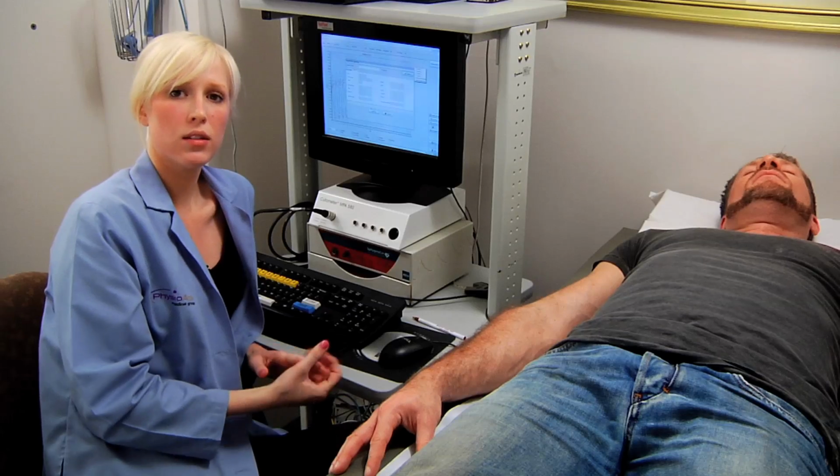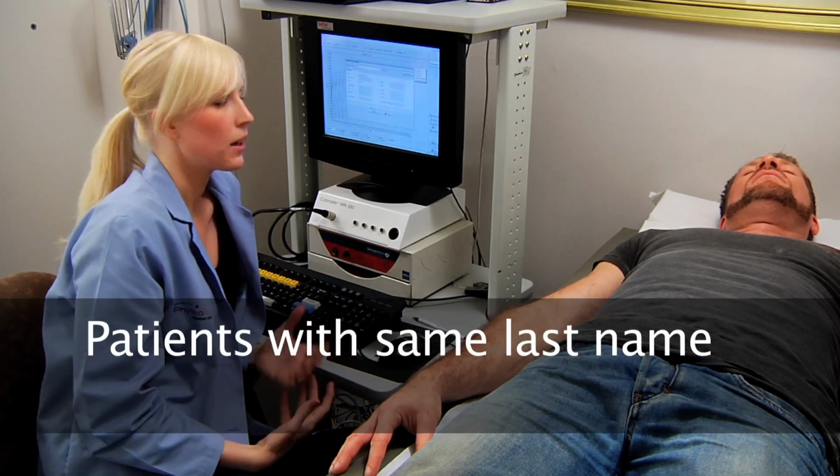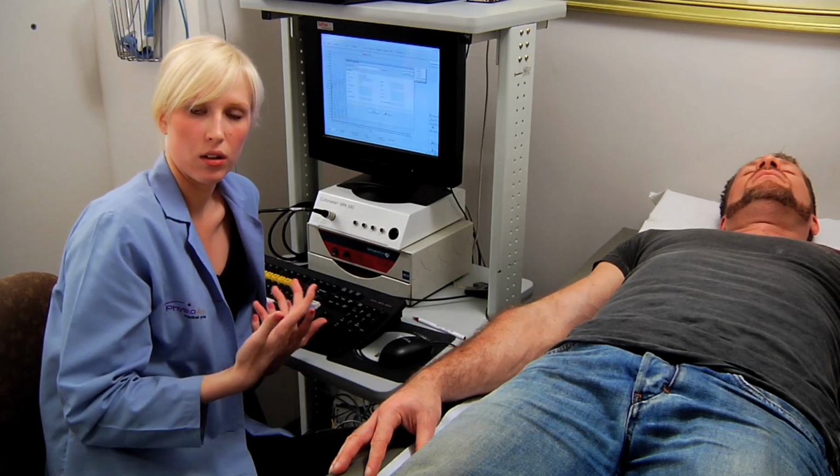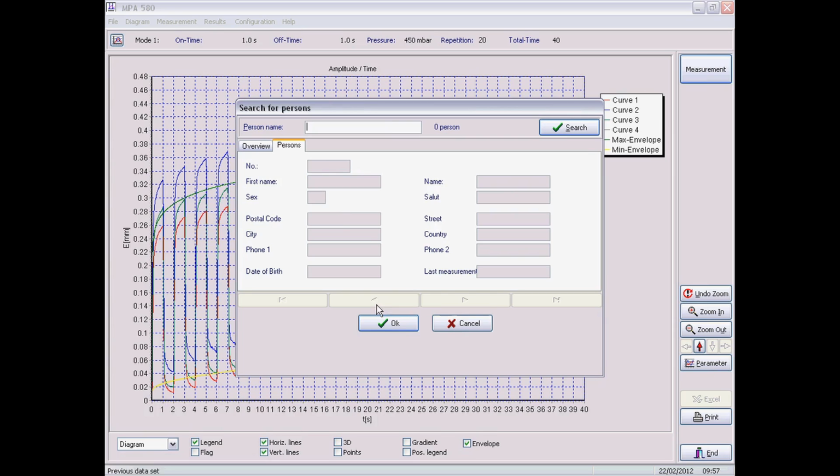Oftentimes in your database, if you have 2 patients with the same last name, it'll ask you to choose which patient you have selected. So you'll have to go and specify which patient you have. It's going to bring you to this menu, and you're going to hit Overview, okay?